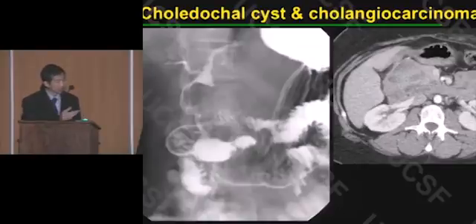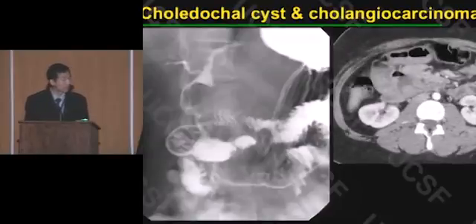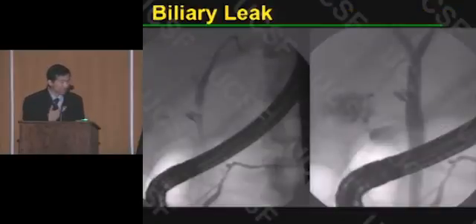And we get about one case every year, every other year. It's really sad. It could have been prevented had the entire cyst been resected. So that was a fatal cholangiocarcinoma in a very young patient. Let's move on to iatrogenic injuries or bile duct injuries. This is an example of a patient who has had a cholecystectomy.